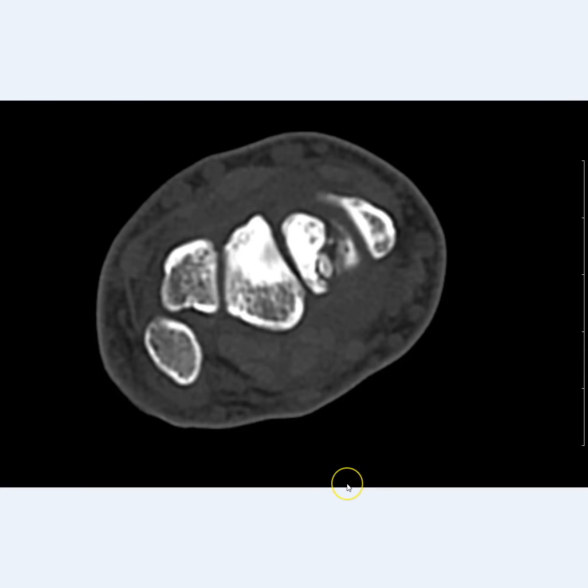So moving on, this is the first image of the CTs that were performed on the wrist. This is an axial cut CT. This also shows the displaced fracture in the scaphoid right here, and we can also see the sclerotic changes of the proximal pole of the scaphoid in this cut.